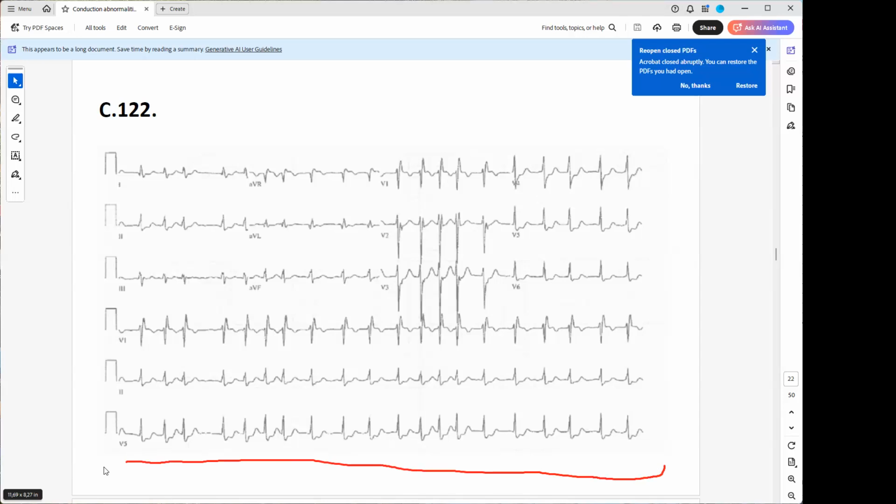Okay, it's not rhythmic, because the RR values are different. I can't really see the boxes, so I couldn't really predict. It's okay, but the rhythmicity, you can judge the rhythmicity.